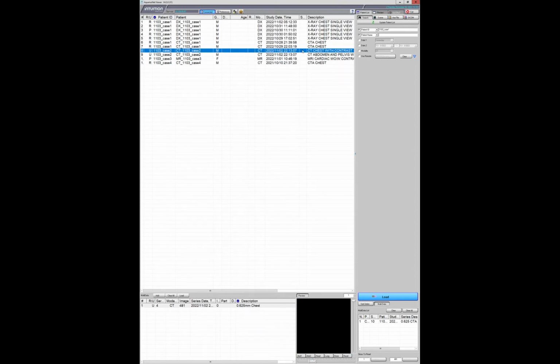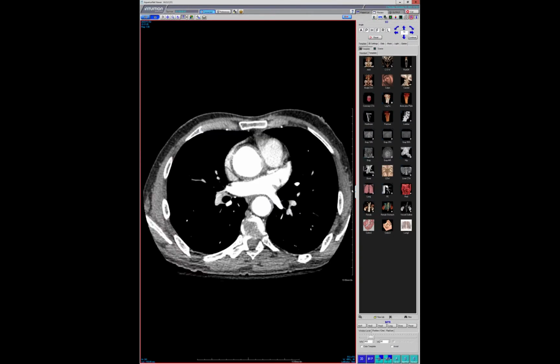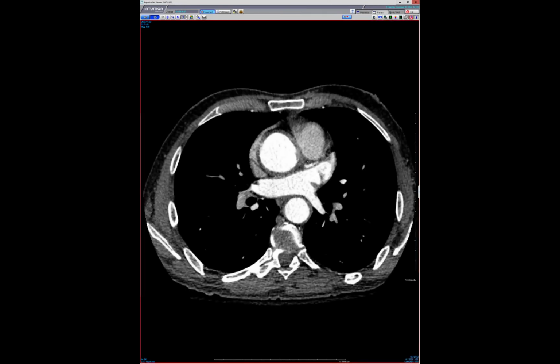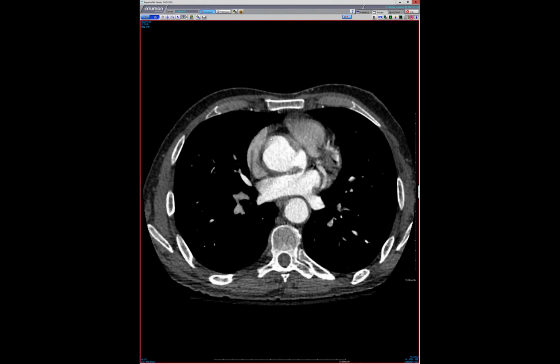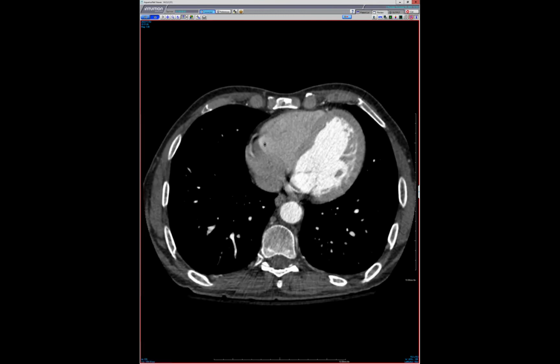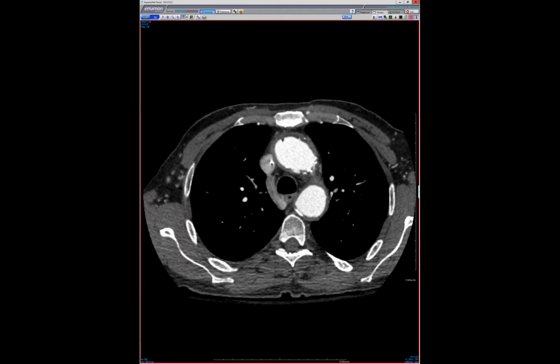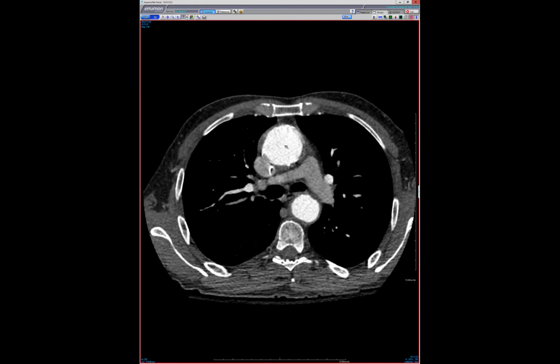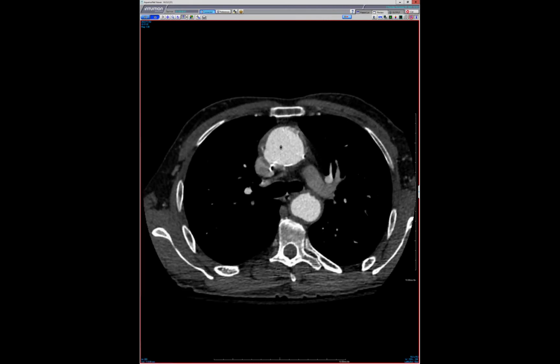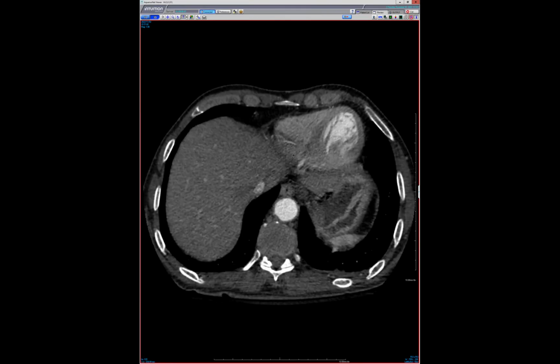And then the case, for me, the case of the year, which I was going to wait to see if Travis got on for. I toot my horn plenty, but I was really impressed by this. This was a guy who literally comes across my study, a cancer workup. You notice the aorta is quite funky. It's aneurysmal, it's got really circumferential wall thickening. There is some atherosclerotic disease, or at least intimal calcification, involving the descending thoracic aorta.